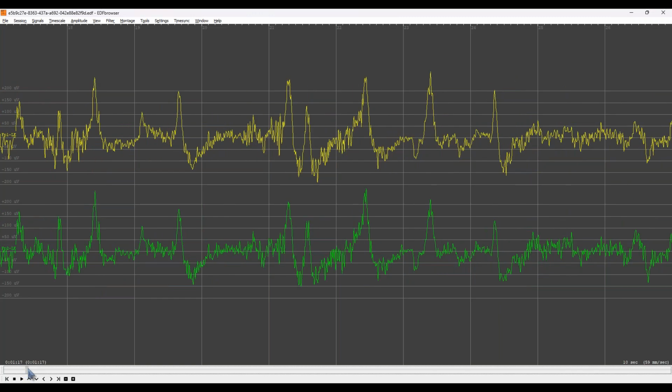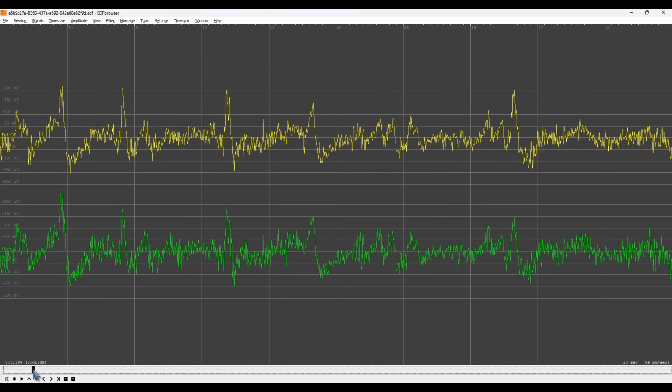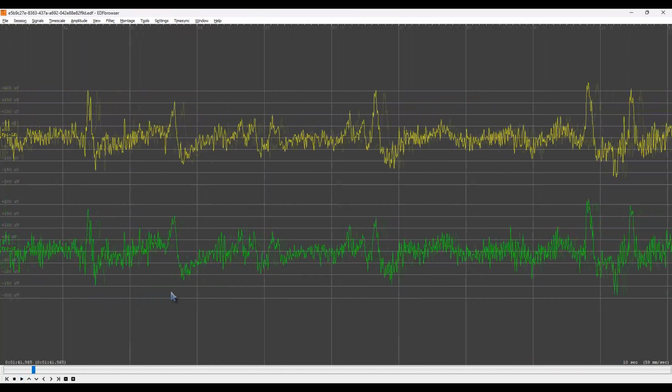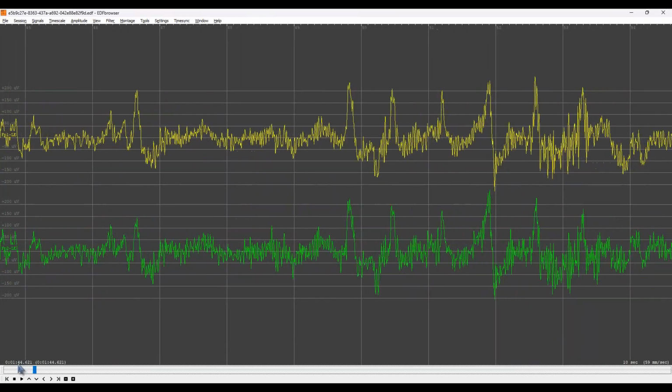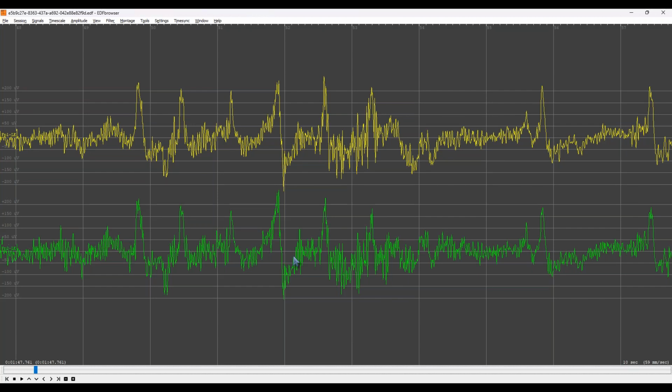So then at the bottom, it's kind of like a movie player. You can just click play. That's going to start running it back. If I wanted to, I could, where is it? Let's see. There we go. So they have the amplitude section. You can choose the amplitude of your signal, so if you need to see it a little bigger.